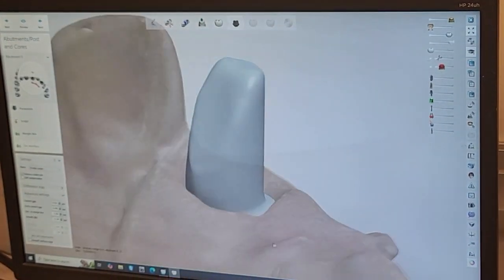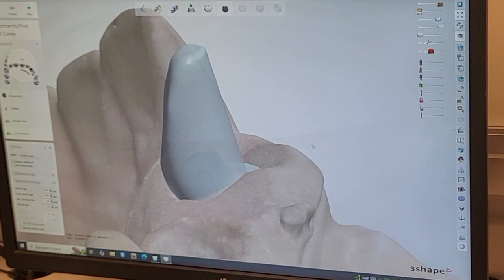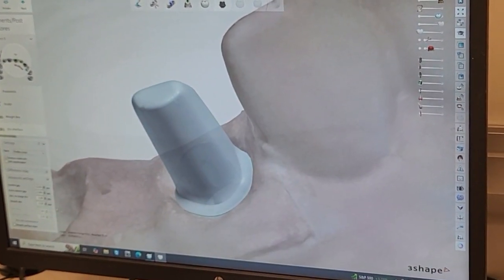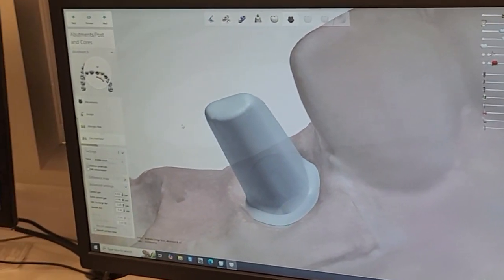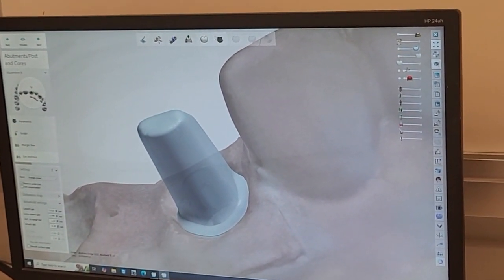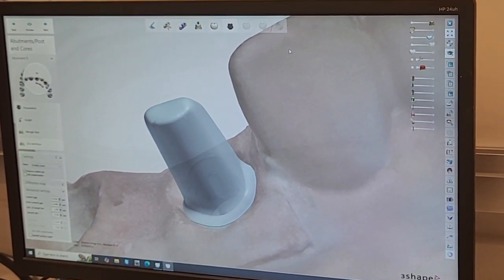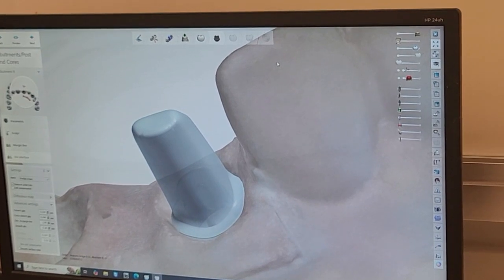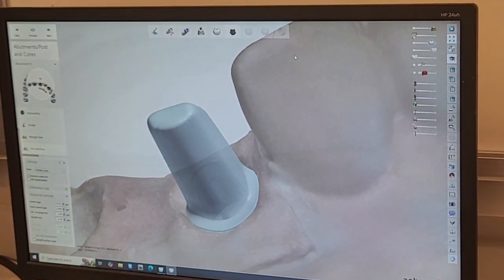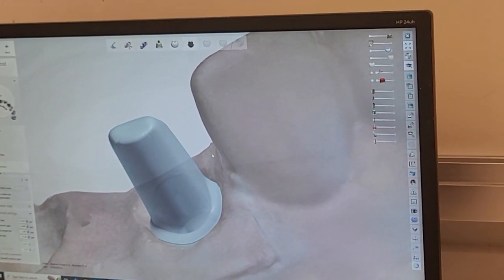Once you have everything done and the software tells you you're good, you're gonna move to the abutment number 11, and then at the end it's gonna bring all together with the bridge. And then once again you check everything, it should be flagged, checked, and then you save it, and that's what Professor Bala is gonna grade.